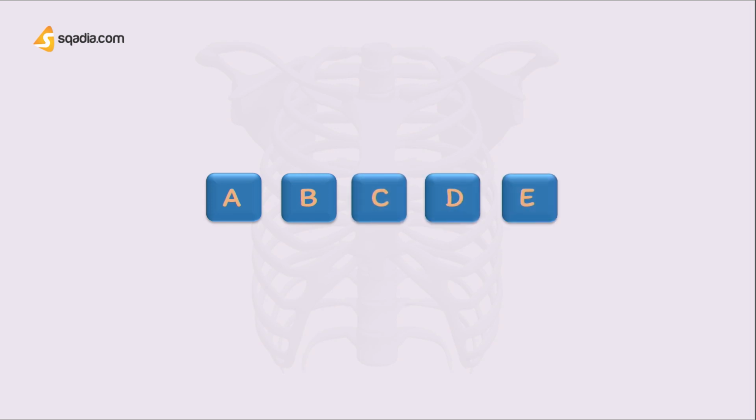And that's it. We've now gone through a normal chest X-ray, how to present it, the airway, breathing, circulation, disabilities, and everything else, as well as some common pathologies.